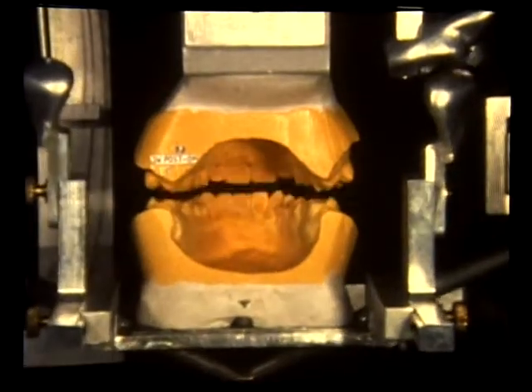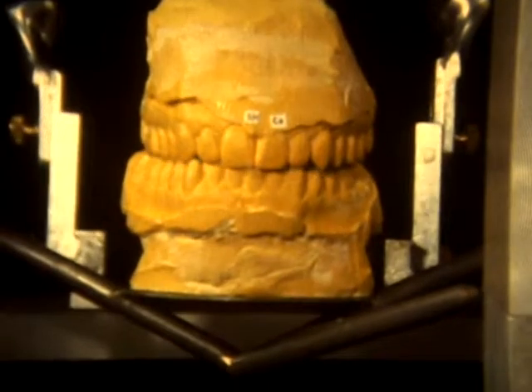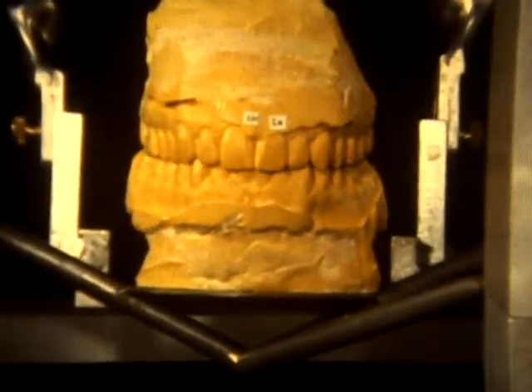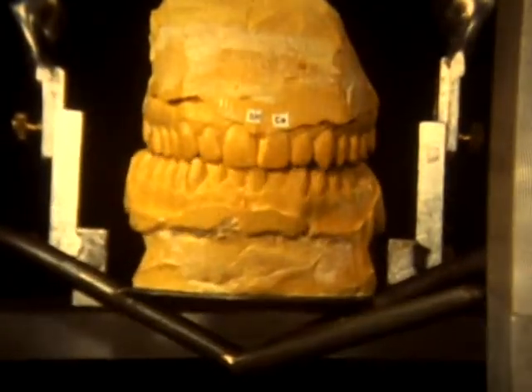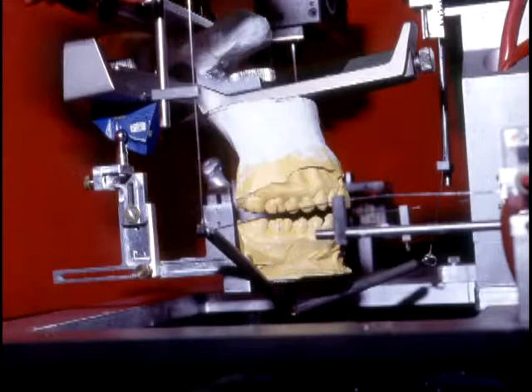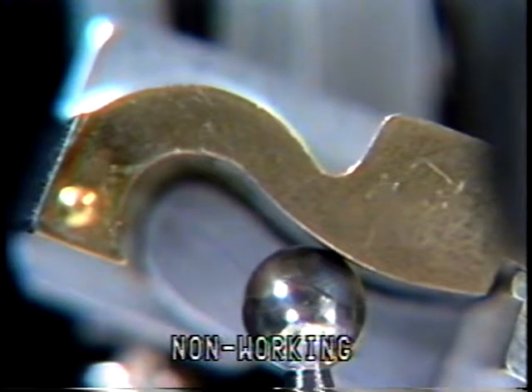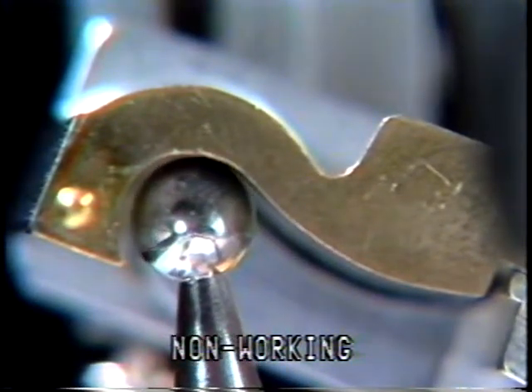Metal condyles were one of the visual displays. They were related to the mandibular teeth by using patient coordinates obtained with a caliper measuring device described in the textbook. Articulators were similarly mounted in the replicator, demonstrating how their condylar controls moved during chewing by using the data recorded on magnetic tapes.